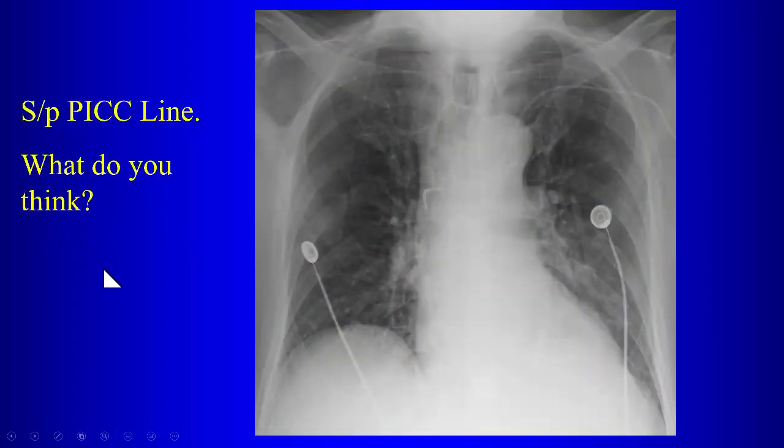All right, so this patient has had a PICC line, and they have a follow-up x-ray here after placement of the line. So what are the things that we want to look for after placement of a central line? It's the left one, it's kind of across the midline. Okay, so the tip, you're happy with the position of the tip, first of all. Maybe just the tip, but like the course of the catheter. Is there anything about the course of this catheter you're concerned about?